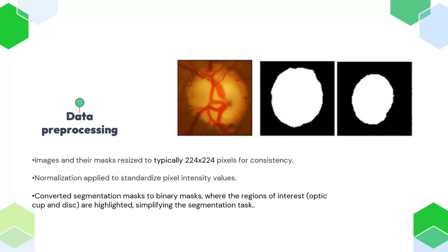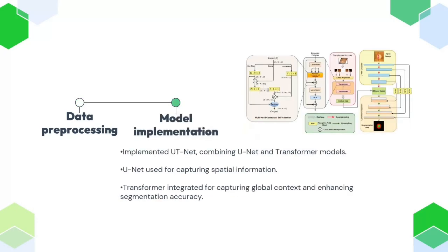As a result, we have applied standard pre-processing techniques commonly used in image segmentation tasks. Now we move on to the next step, which is model implementation. In this step, we defined a model which is UTNet.